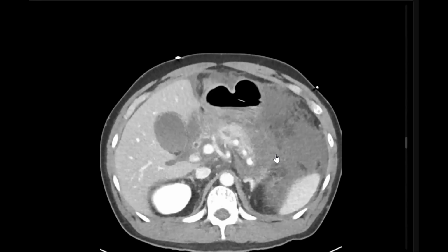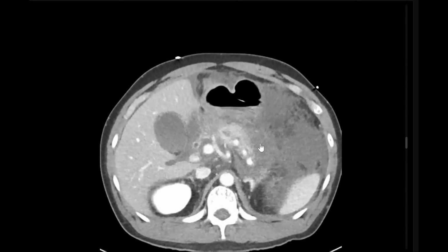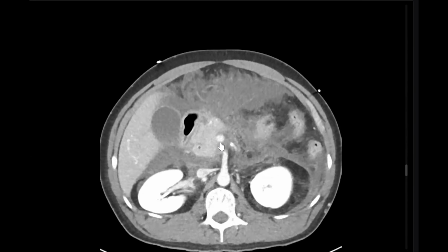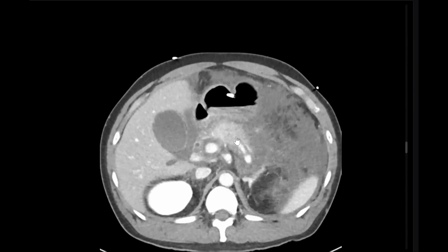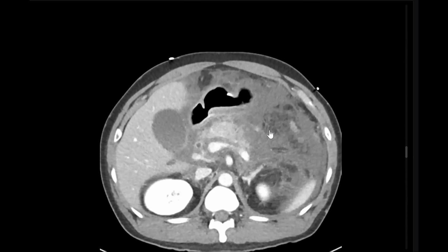So this is the first point to be determined, the type of pancreatitis. Then describe other findings like collection within the parenchyma and around the parenchyma, and any local complications like venous thrombosis. Assess the superior mesenteric, splenic, and portal veins, and also pseudoaneurysm formation. And how to rule out hemorrhagic pancreatitis: in the pre-contrast study, look for hyperdensity. So it's important to mention this point also: vascular complications, local complications, fluid collections. I will mention this in a minute.